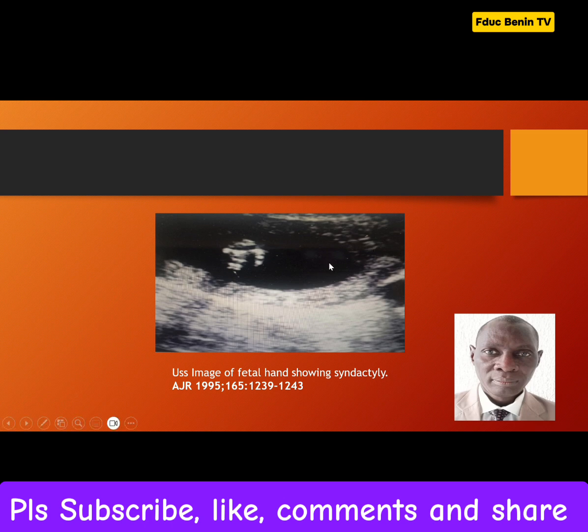Now, I mentioned fusion as in syndactyly. If you look at this picture, you can see that the 2 middle fingers are fused. And we can appreciate the fusion because the bones of the 2 middle fingers are actually fused. You cannot differentiate them. The soft tissue fusion you cannot actually appreciate very much with the ultrasound.